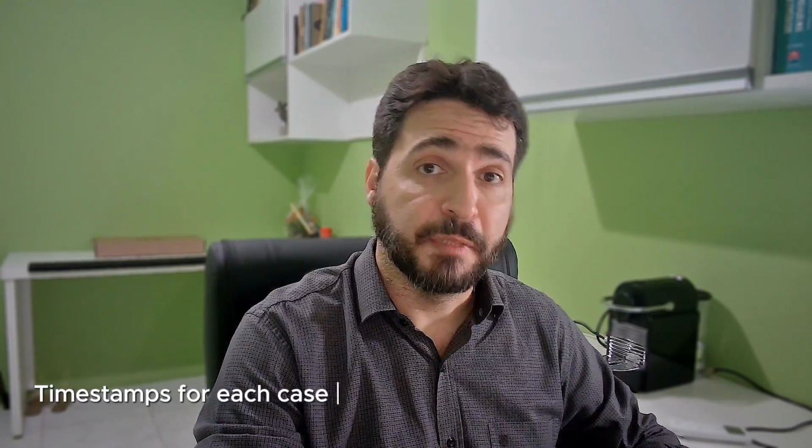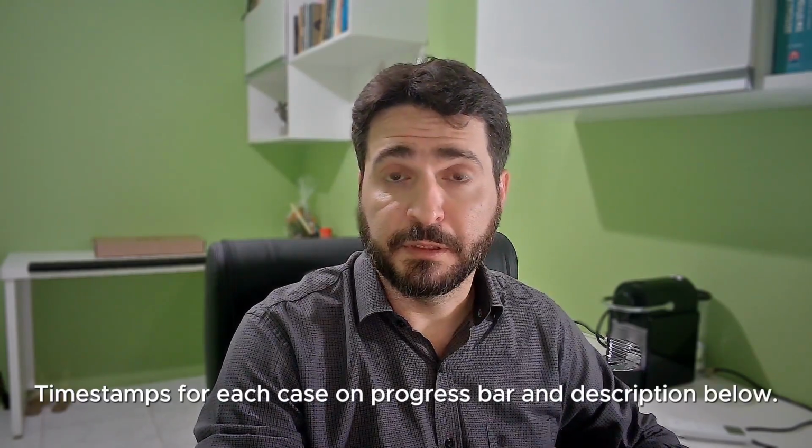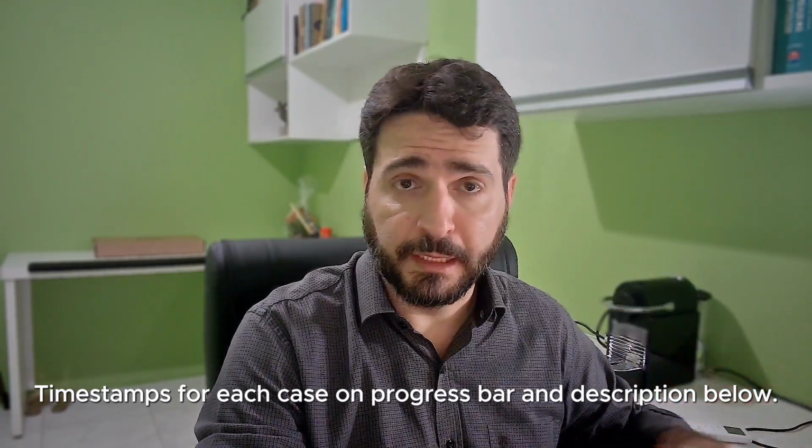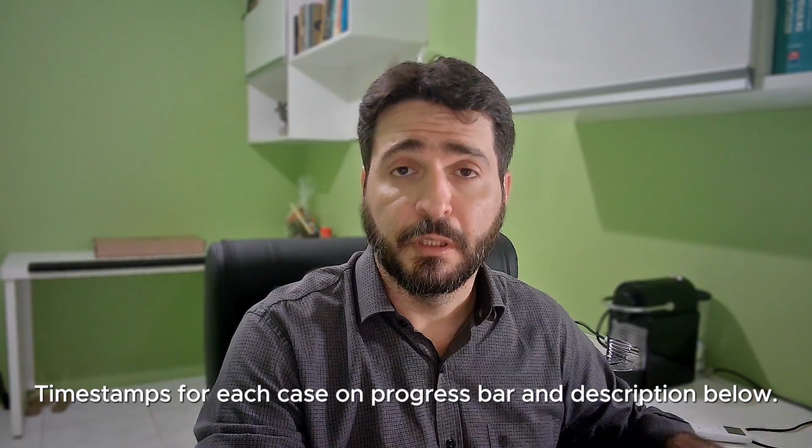I'm a diagnostic radiologist. In a few moments, I'm going to share with you the screen of my workstation, where we'll be able to see everything I see on about 10 or 12 CT scans from the emergency. We are going to go over the images, I'm going to comment on the findings, I'm going to show you everything I see as pathological or normal, and we are going to eventually reach a diagnosis. Then I'm going to report the exam and comment on terminology, what should be reported, what shouldn't, why I do this or that, and all that good stuff.